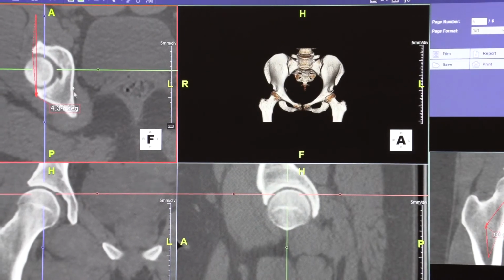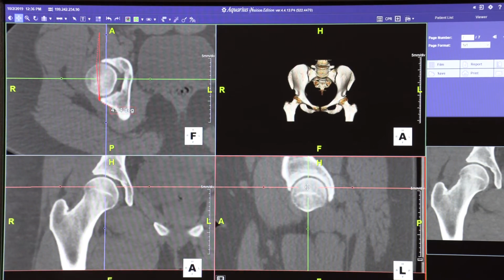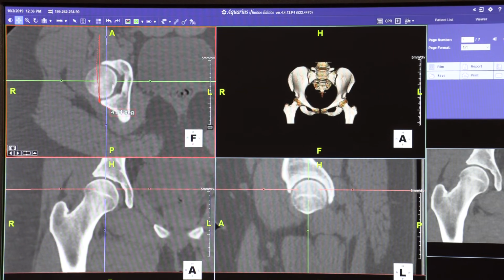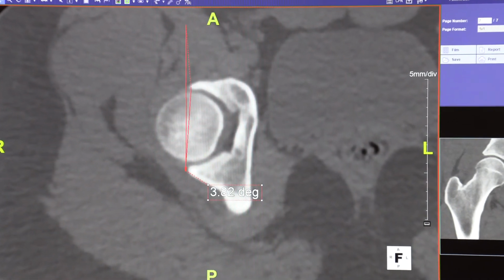Now, so you got that measurement at 1 o'clock, you take that picture, you can just bring it down right here at about 2 o'clock. And at that point, you should start to see a little bit of the fovea, not too much, just starting of the fovea. So at this point, you can just adjust it, and here it goes this way.